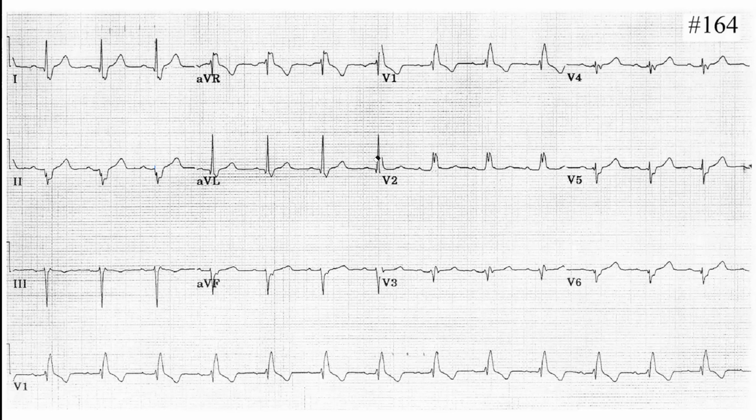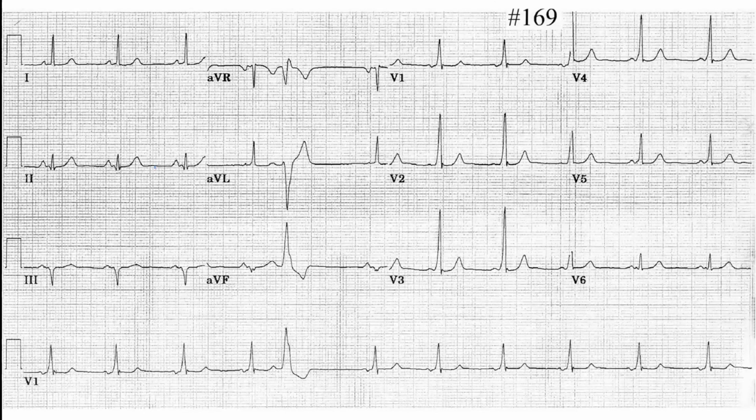Pathological Q wave? No, we haven't reached pathological Q wave. Hypertrophy? No. So that's finished right now. And again, you do see these secondary ST-T changes due to the abnormal conduction. Good, all right. Let's move on.